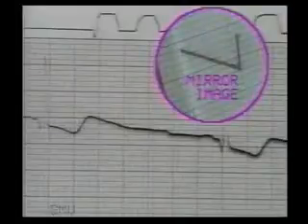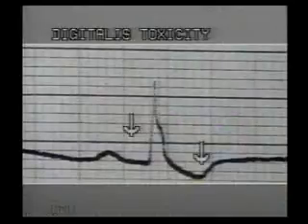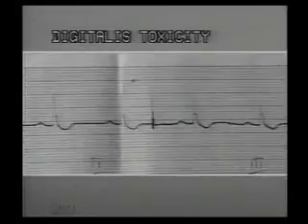The T wave is flat. It is best seen in leads with a prominent R wave. The inset shows the mirror image. In this ECG, note the characteristic ST depression with slow downward slope and steep upward rise. The T wave is flat and the PR interval is prolonged, indicating first degree heart block.